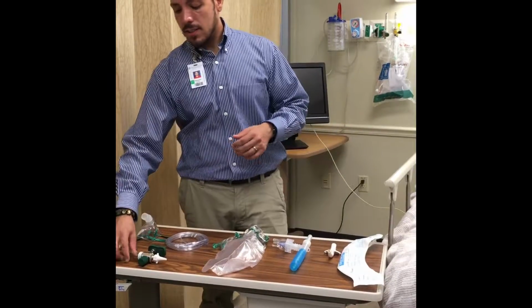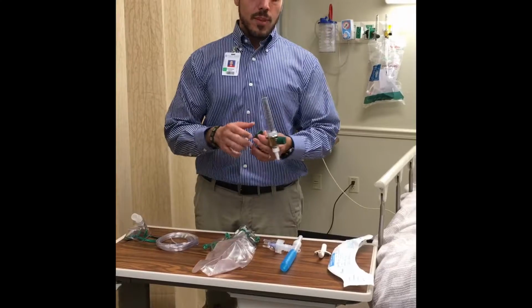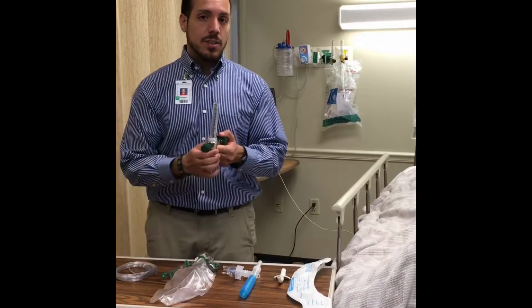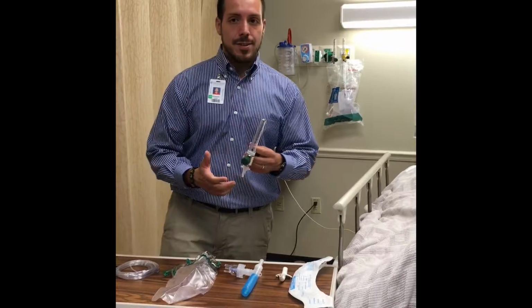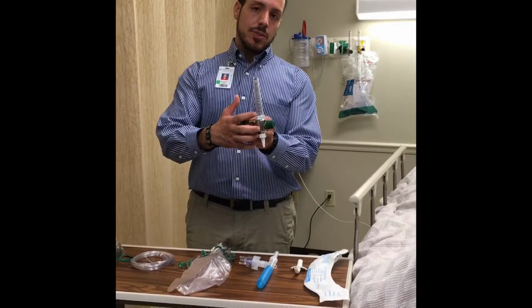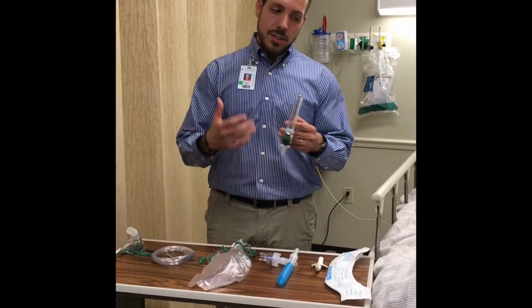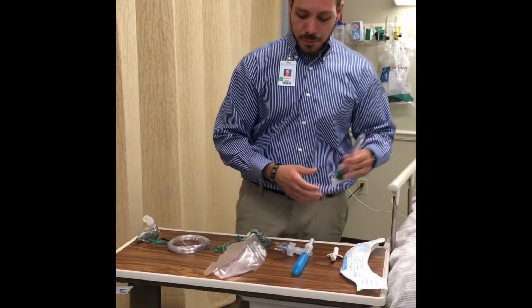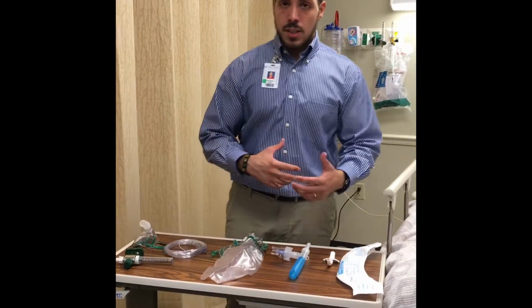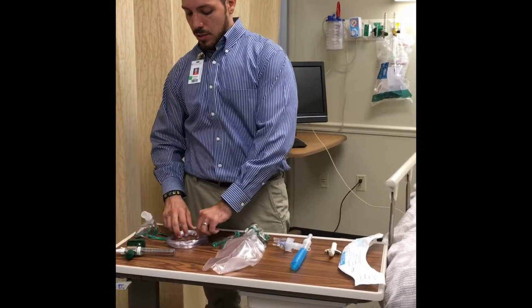Our next device is a flow meter, and you're going to see it right behind me on the wall as well. With the flow meters, there's typically two colors, green being oxygen, yellow being air, and it does have a ball right in the center. What that's going to be measuring is the O2 liters per minute, and you want to make sure, based on your patient, it's exactly where it needs to be. So that's typically going to be hooked up to an oxygen mask or nasal cannula to supply oxygen to the patient.